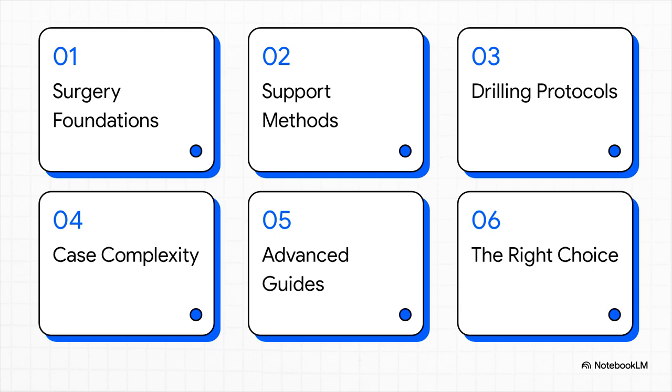1. Guided surgery foundations. 2. Classifying by support method. 3. Drilling protocols explained. 4. Navigating case complexity. 5. Specialized advanced guides. And finally, making the right choice.